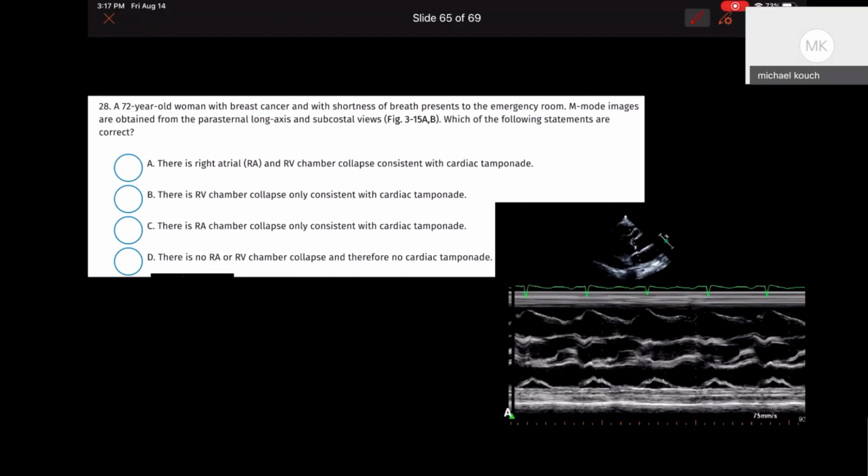So this is good for everybody in the group. This is a good way to think about when you're taking your tests for the boards, right? And get into the pattern of using your ECG markers. Your ECG leads are so important in determining where you are in the cardiac cycle. And then hopefully this will encourage you to use the ECG leads in our daily practice. So this here, for the most part, is systole, right?